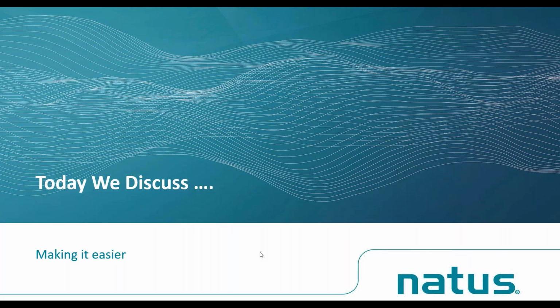And today, we are going to discuss something that is less common. In tour 1, we were thinking mainly about neuropathies, primary muscle diseases, routine needle EMG, and so forth. Today, we are going to focus on 3 aspects. One is the neuromuscular junction testing. And then we will also touch briefly on autonomic testing, as well as evoked potentials.